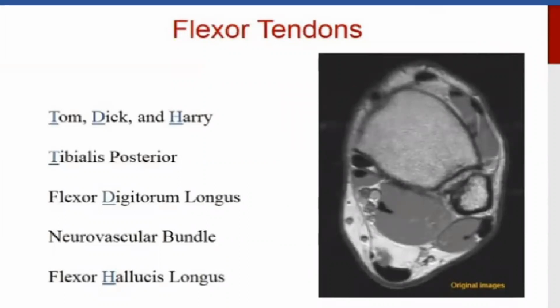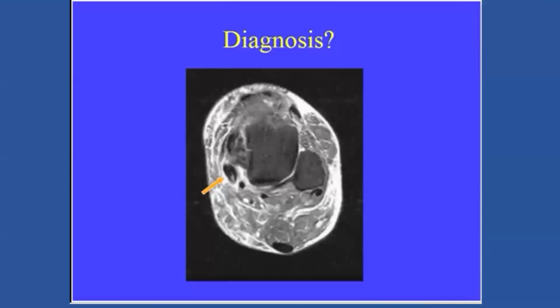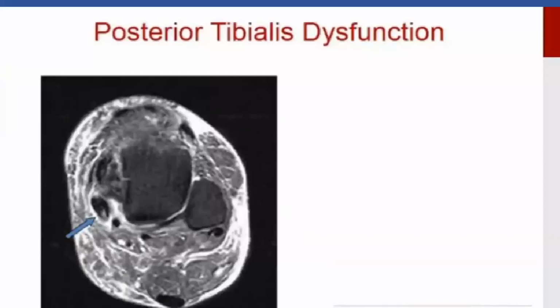Don't forget about the tibialis posterior, which can be damaged, can be insufficient, can have a lack of circulation, because we have a watershed zone in the tunnel for the tibialis posterior, and this can rupture. You see that there's fragmentation. You see it more clearly over here.